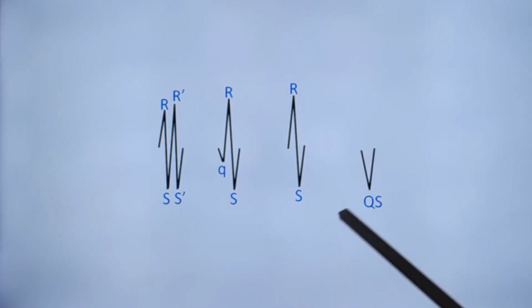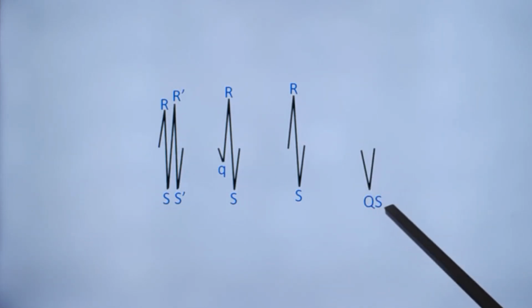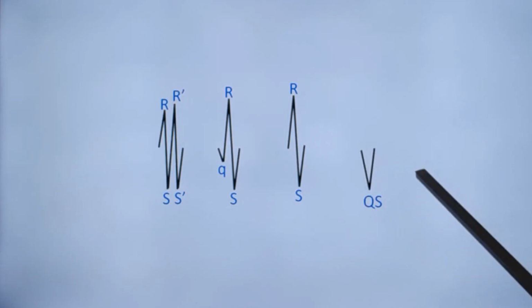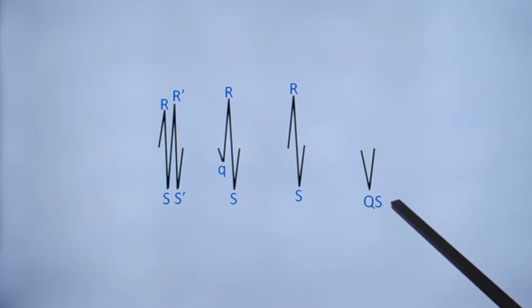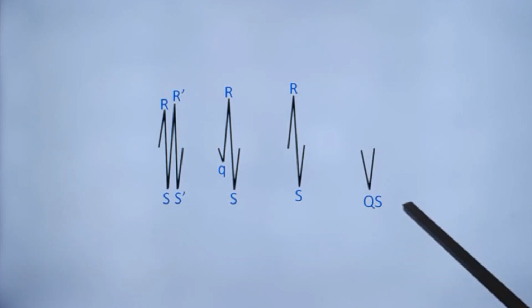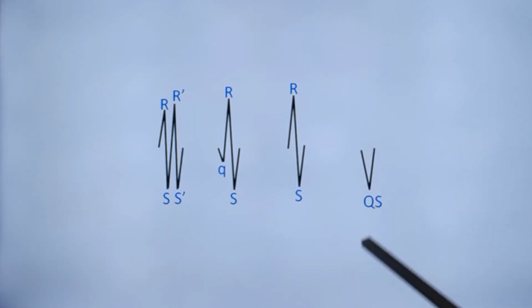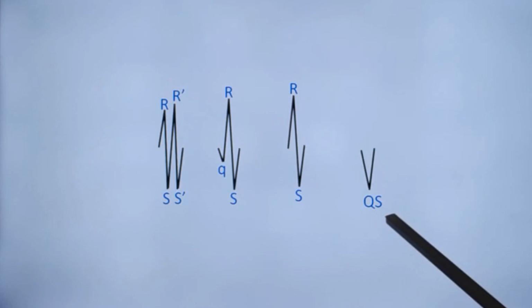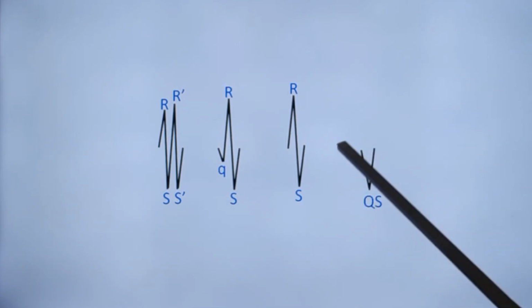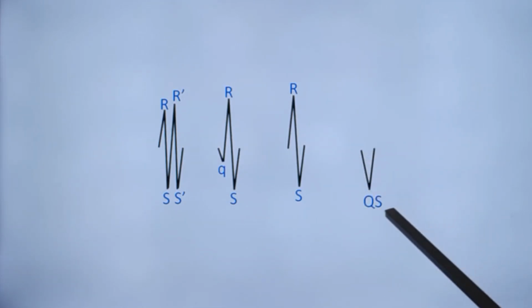There is still another condition often seen in myocardial infarction, old myocardial infarction. There will be no R wave, there will be only a negative deflection, sole negative deflection. It can be called either a Q or most often as a QS complex, because it is a combination of a Q and S with no R wave. The R wave in this region has been knocked off by the myocardial infarction. That is why you presume that there is both Q and S together. R wave is not seen, so it is known as QS complex, typically seen in old myocardial infarction.